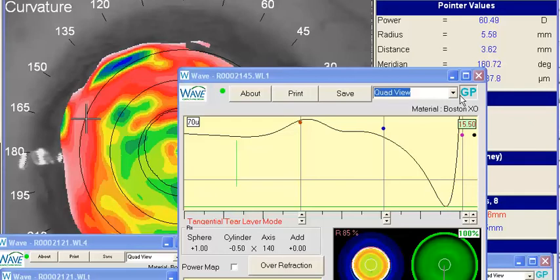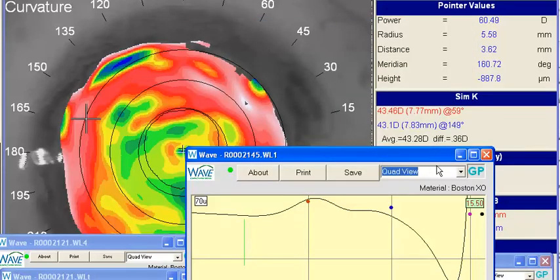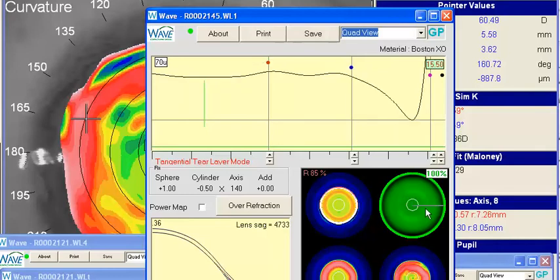I pulled up here your most recent design. I think it's actually a pretty nice design overall, but I think where you're being limited a little bit is because of this back OZ point, just from the sheer limitations of the lens curvature. I think when this is a smaller OZ, it's going to limit how flat you can get this peripheral curve out here.